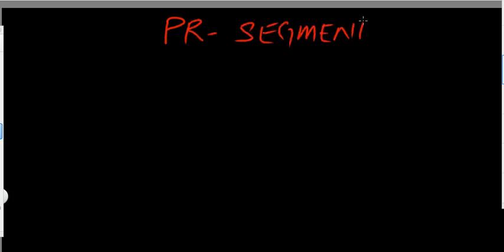Now, what about the PR segment? In the PR interval, we included the start of the P wave and the start of the Q wave.